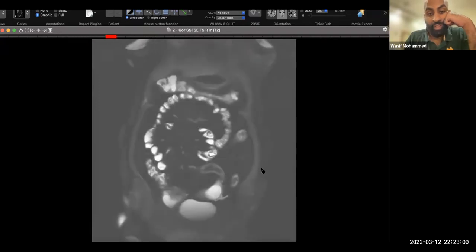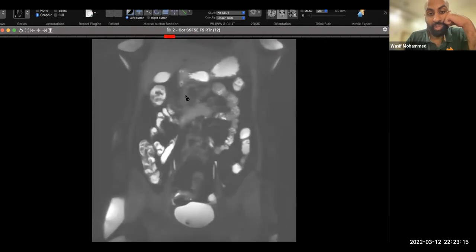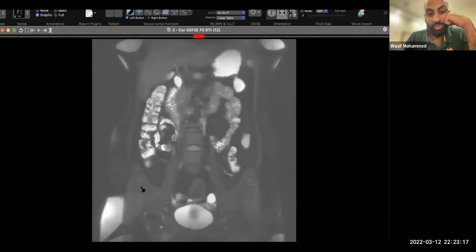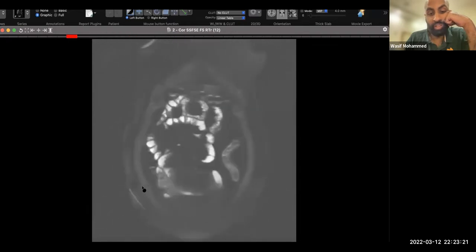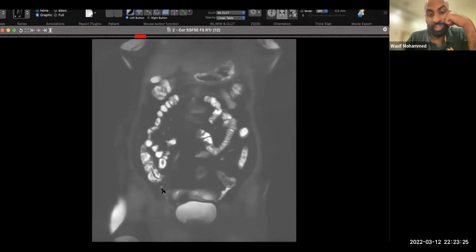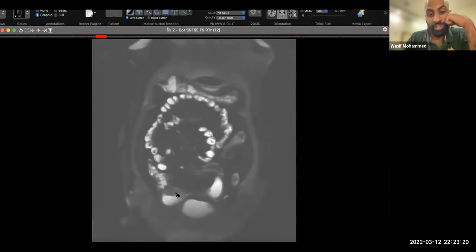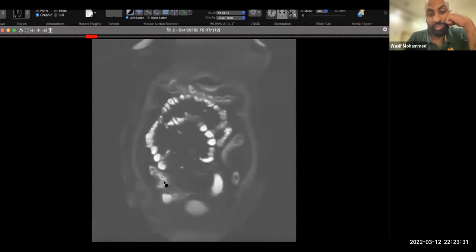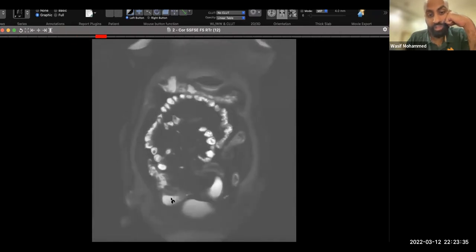So then almost immediately when you see an MR enterography study, go to the ileocecal junction. Trace a large bowel like you did. Okay, no problem. But come down to the cecum and try to find the ileocecal junction. It's a bit tricky in this case, I'll admit, because it's a little low down in the pelvis. And you can see that there's this circumferential wall thickening of the terminal ileum, and at the distalmost aspect of the ileocecal junction, there's almost fibrosis. There's fluid adjacent to it.